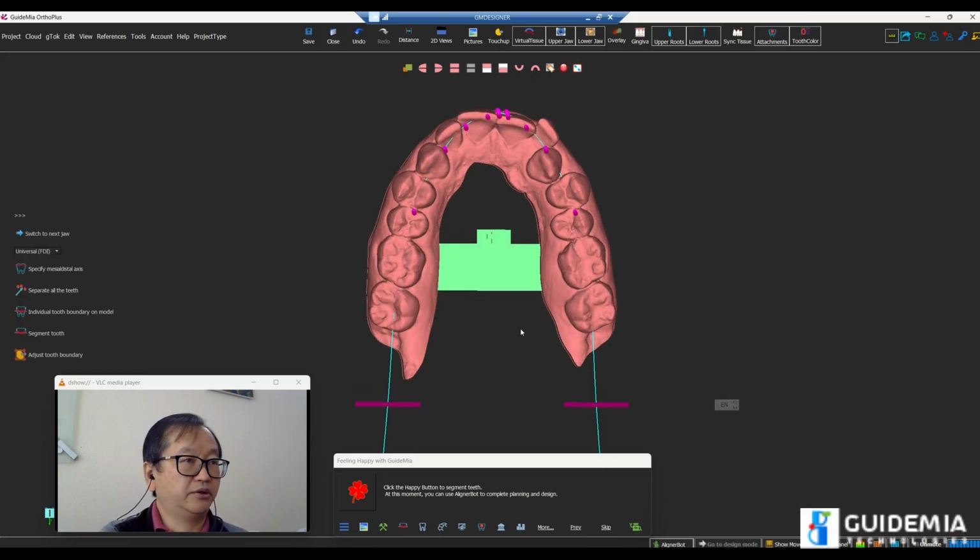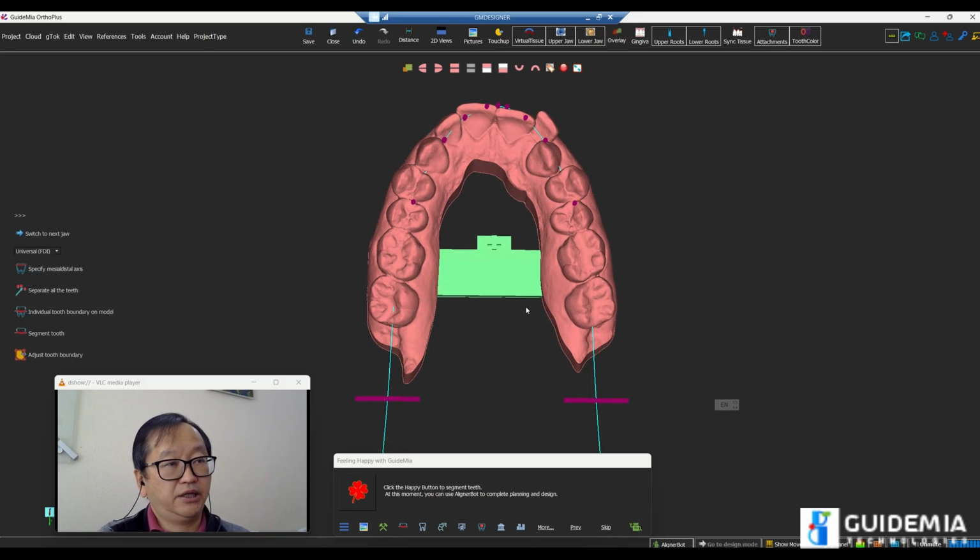When you print the model, you can read the text here, or use AI or other software tools to automatically extract the data to mark which model and which case it is.